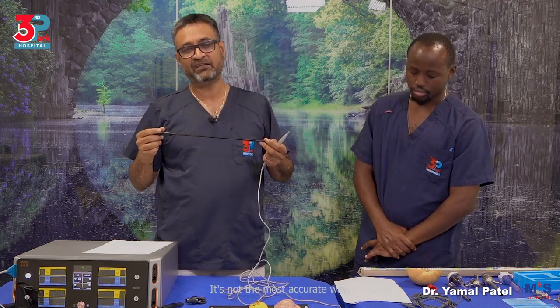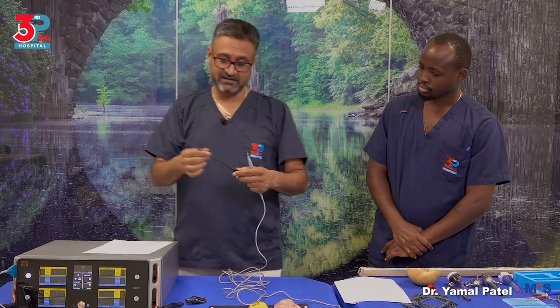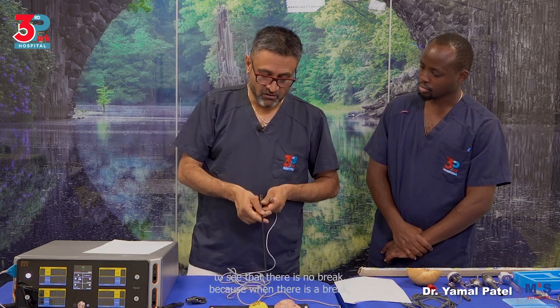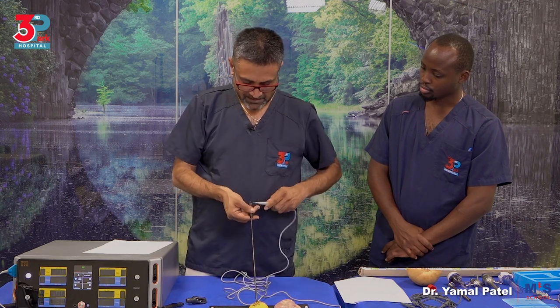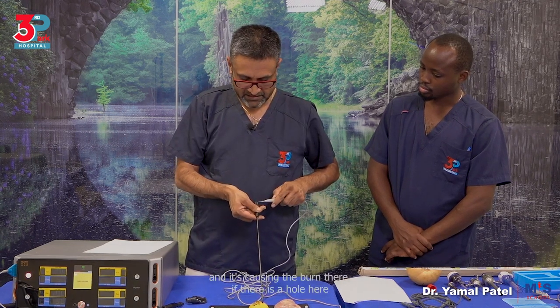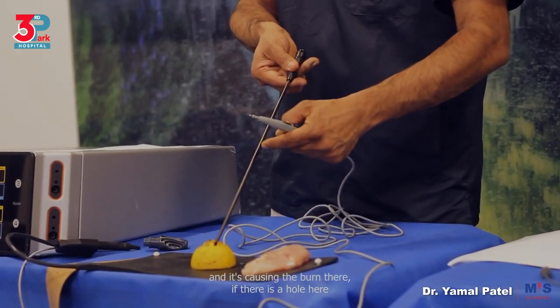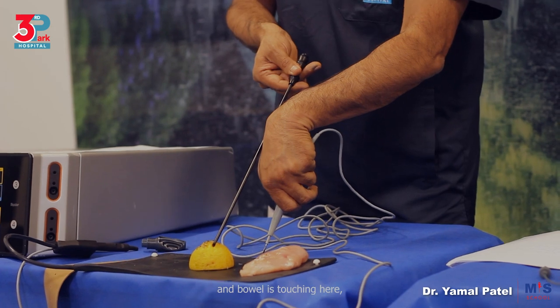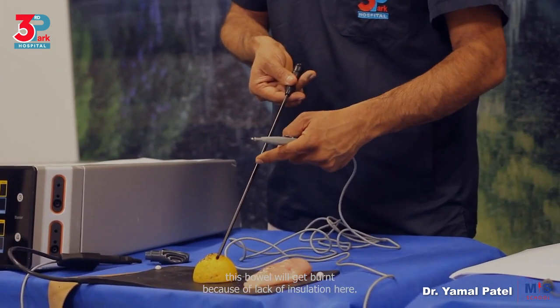It's not the most accurate way, and then there are instruments that can be used to explore this. I mean, there are techniques that can be used to explore this instrument to see that there is no break. Because when there is a break, if I'm activating it here and it's causing the burn there, if there is a hole here and bowel is touching here, this bowel will get burnt because of lack of insulation here.